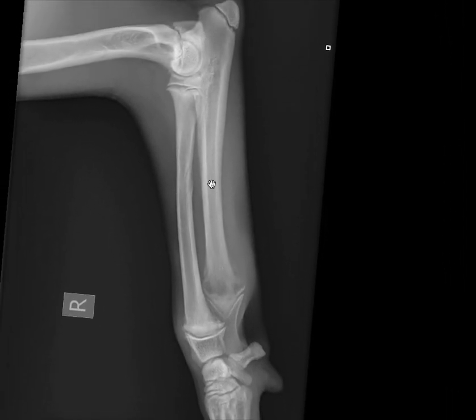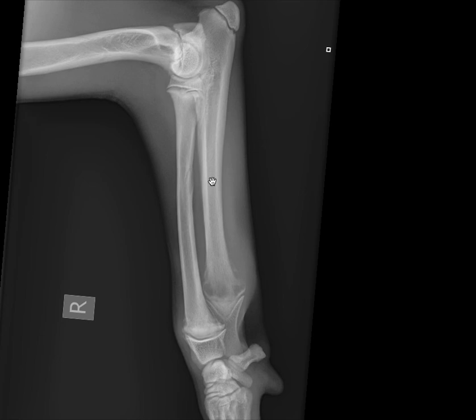Whenever I'm assessing a musculoskeletal radiograph, I like to follow the ABCDs approach. A stands for alignment, where I make an assessment of the alignment of the entire limb, so much as we can tell that in a non-weight bearing radiograph, as well as alignment of particular bones in relation to each other. In this case, for example, the cuboidal bones of the carpus, or given that it's a juvenile, we can also pay attention to the alignment of the epiphysis relative to the metaphysis and diaphysis.